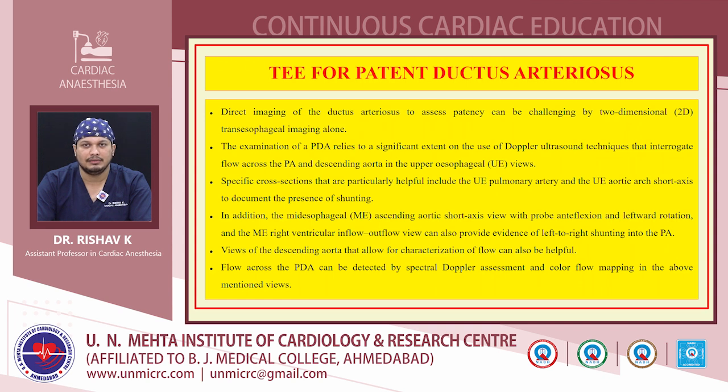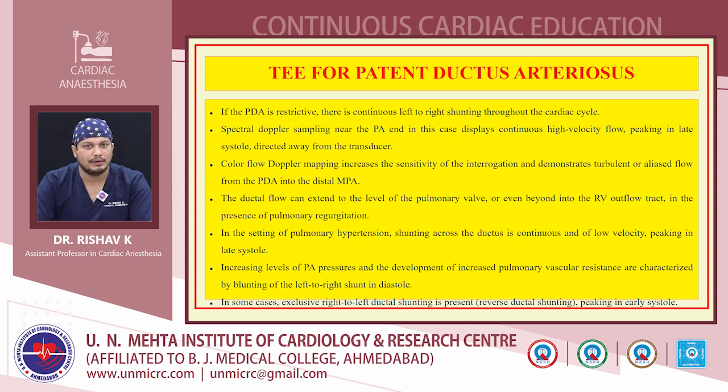So here the goal of TEE is mostly in the intraoperative period, not as a tool to guide the surgical plan, but mostly to verify that the surgical plan results in appropriate management of the lesion, and also to evaluate for associated anomalies. And rather than going for a specific view-based approach as we do in adult transesophageal echocardiography, in all cases where pediatric transesophageal echocardiography is done for evaluation of congenital lesions, we have to go for a structure-based approach.